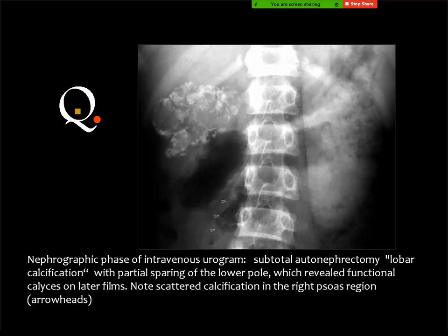Calcification seen, mass calcification or lesion calcification in the right kidney, with nephrogram on the left kidney. Okay. I think there is a calcified kidney on the right and there is obstruction on the left. This is called the nephrogram. Calcified lesion in the right kidney.